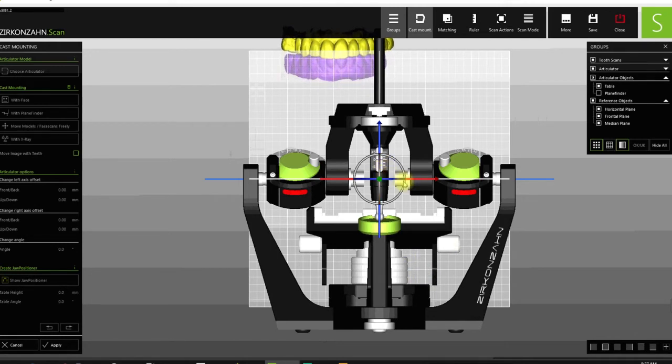Okay. Then the next one I got to do is yaw. So I'm moving the front of that wheel. And I'm trying to just get the same amount of tooth on each side to show. So you can use these little lines here. I might adjust that one a little bit later, but try to look like you're looking straight at it. That looks pretty good. I might adjust later. Now I've done the 3 movements, and then you can just do the other 2 like this.